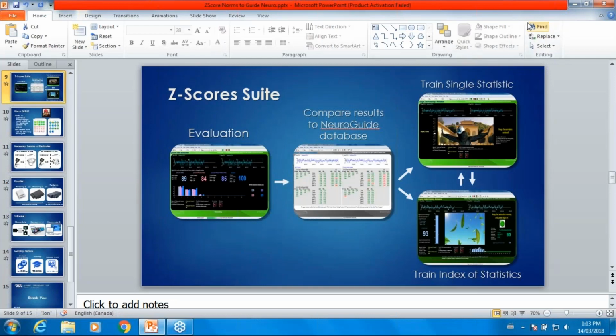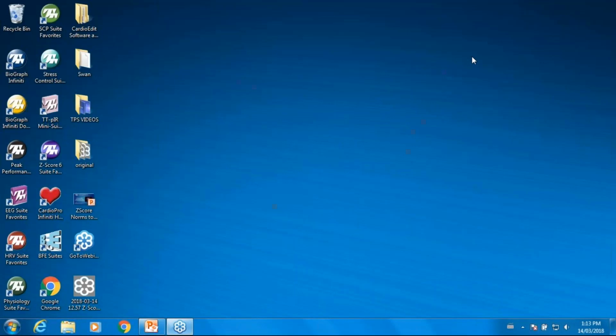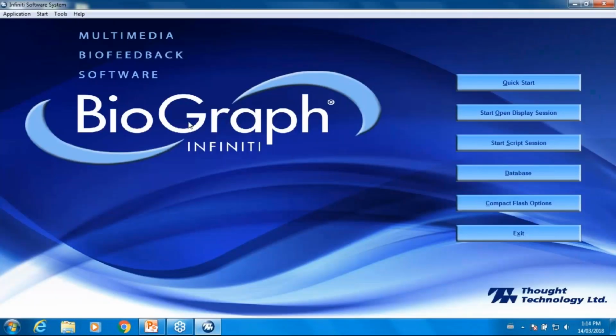All right, let's actually jump right into the software so you get to see what this looks like live. I actually have some electrodes on my head, and so I'm going to initiate the software as if running it with a normal person. You might be a little disappointed to know that apparently my brain is incredibly average, and so it's not going to be too interesting, but we'll be able to see that in a moment.